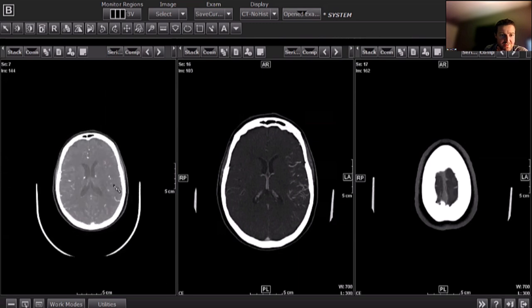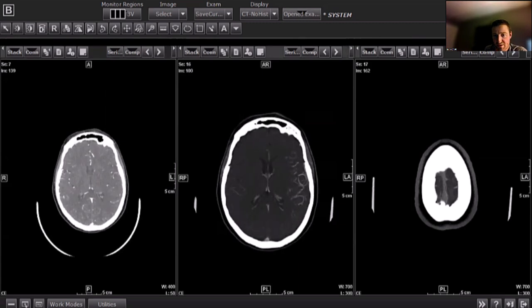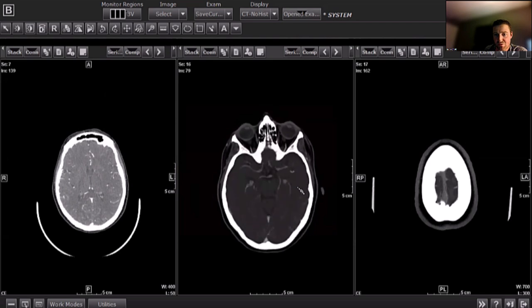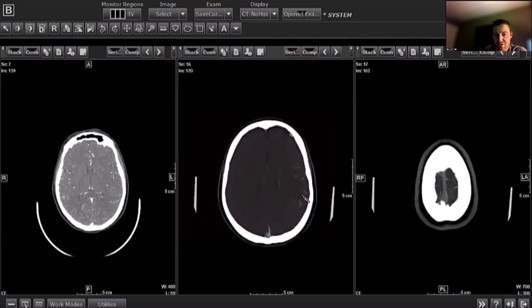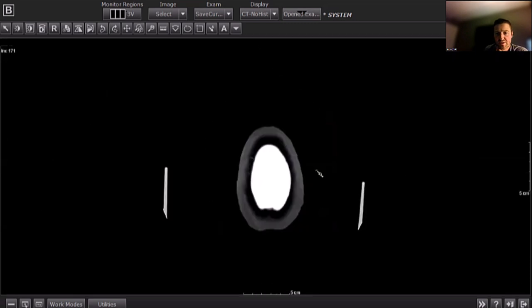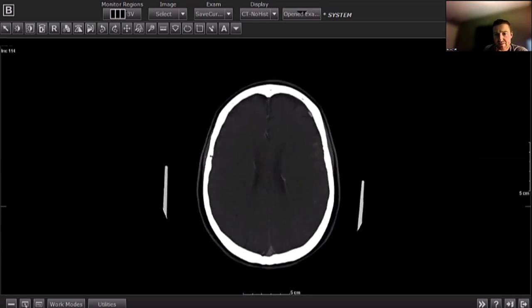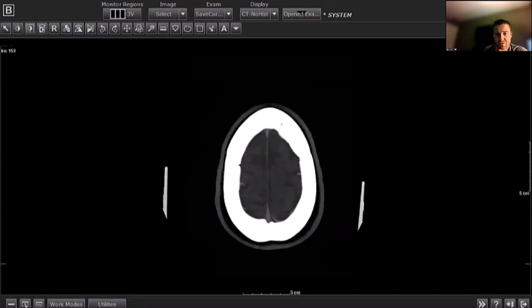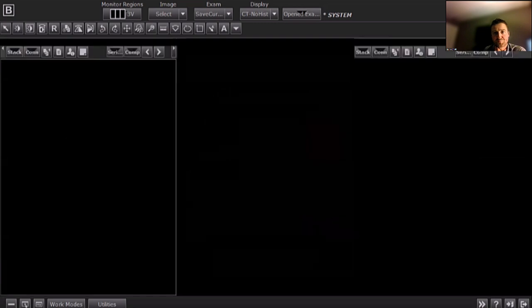We've got good opacification of the distal vessels, great opacification on the first delayed phase, really almost increased in number compared to the contralateral side. So this is a patient with good collaterals, score of 4. You can see it almost starts to wash out on the second phase. So they've actually got fairly decent transit through there.